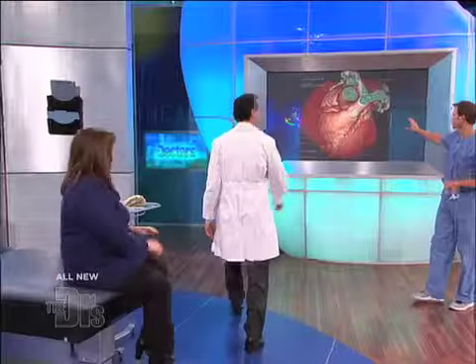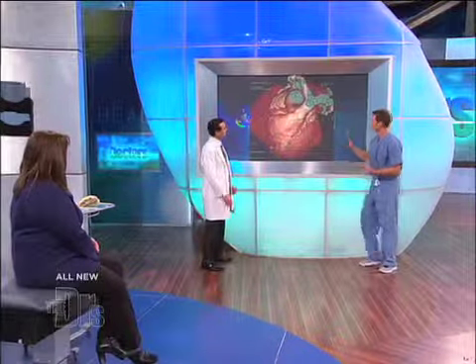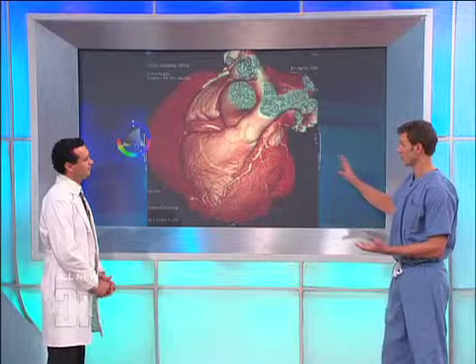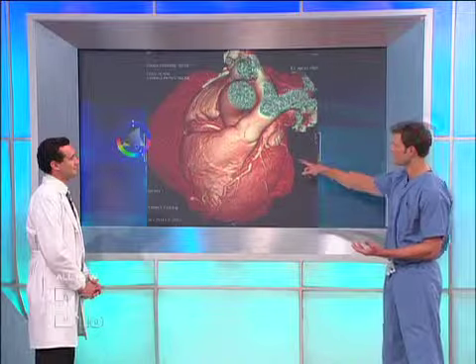Go over to the magic wall, Dr. Kennedy. I'm going to have you just watch from the bird's eye view. First things first, this is an example using this technology of someone who was suffering from very significant heart disease. Highlight to us what we're looking at here.